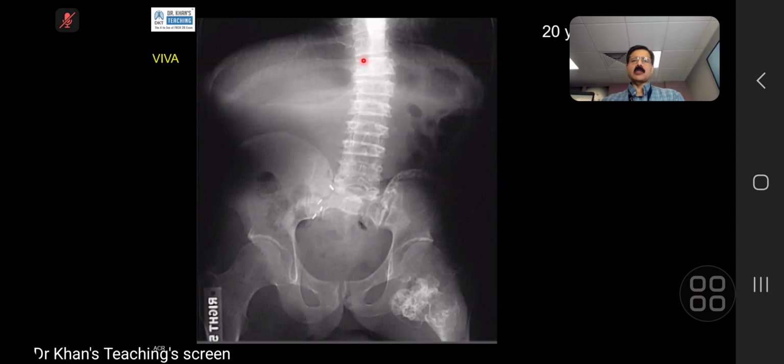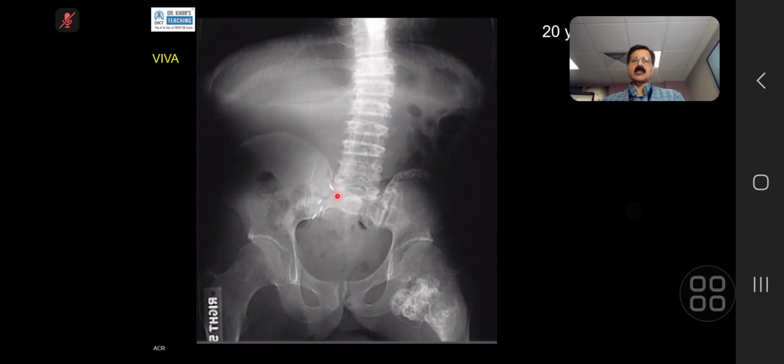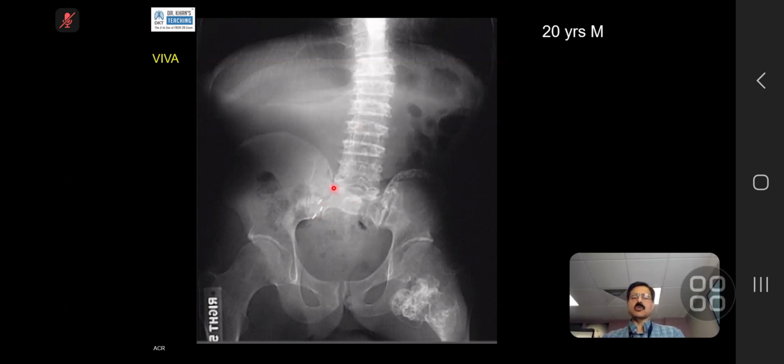If you stretch your imagination, now what is happening? This patient had Wilms tumor. This tells you surgical clips, so there must be some lymph nodes which they have removed. The tumor was on this side. This is the radiation portal. After surgery, they have also given radiation because there were lymph nodes, etc.